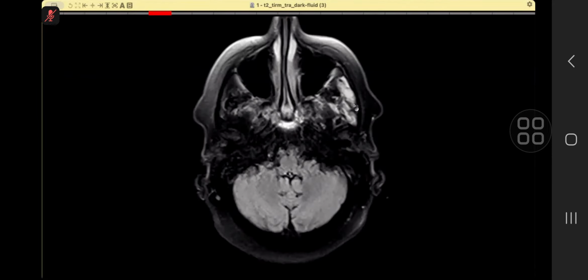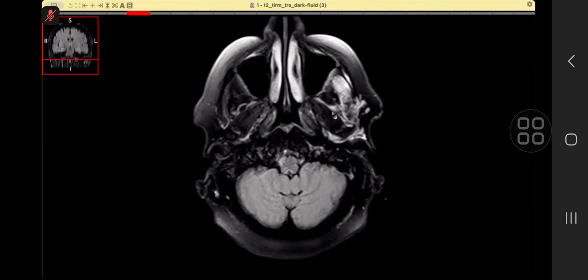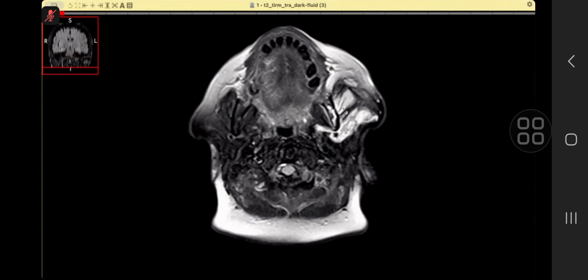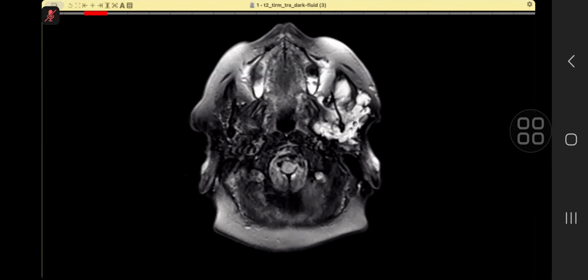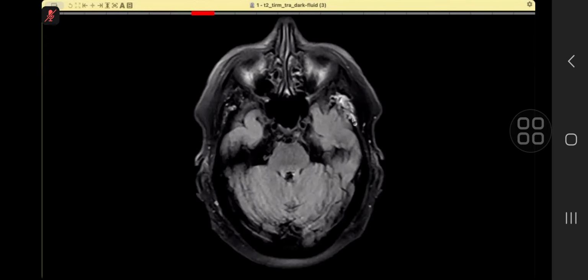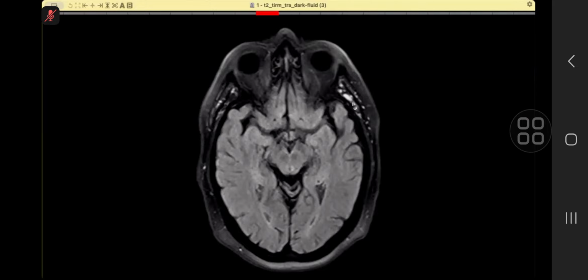So from there, anatomy is that this goes and touches the base of skull. Now, there is a lesion which is infiltrating. It is transspatial. Transspatial means it is going into the masticator space, it is going into the bone, it is going into the parotid gland, and then it goes into not only the mandible but also the sphenoid bone.